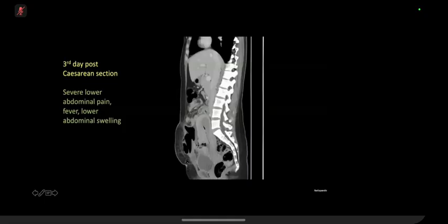And I would want to just rule out that the large locules of gas anteriorly are not within bowel loops, but it doesn't look like there's any kind of enhancement. So I've got free fluid and gas in a patient that's febrile, and I'm concerned that they've got an infected hematoma. I can't measure it obviously, but if it was greater than 4 centimeters, then it would be too large for a bladder flap hematoma, and so this could be an infected hematoma.